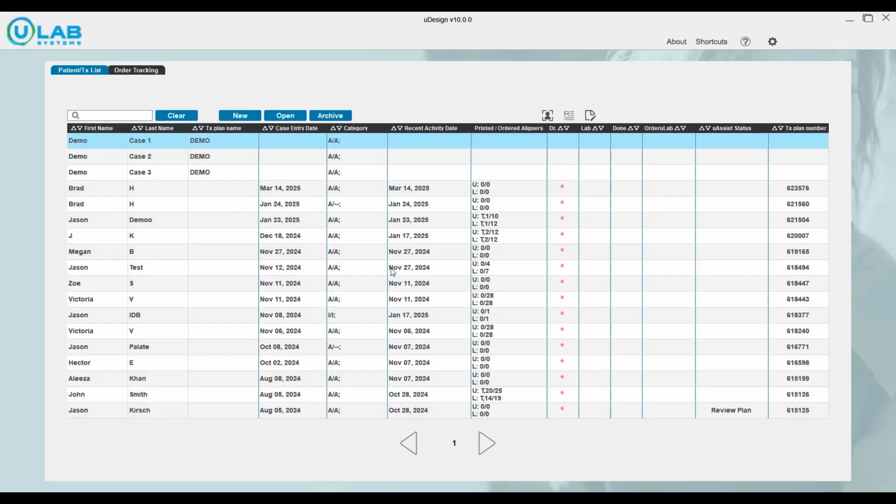In this video, we'll look at the IDB workflow. Indirect bonding, or IDB for short, allows doctors to prepare their bracket positions and treatment plan in advance, and then transfer that digital information into a printable jig that can be used to bond the brackets to the teeth. Doing this allows the practice to apply the braces faster and more accurately than traditional methods.